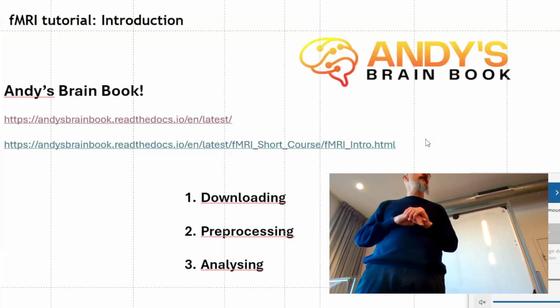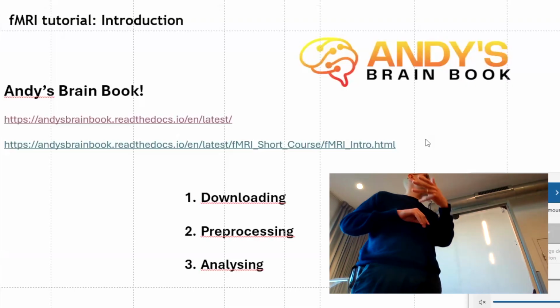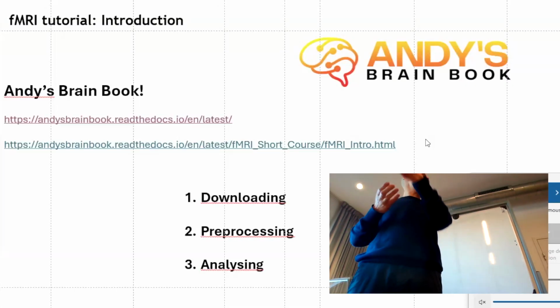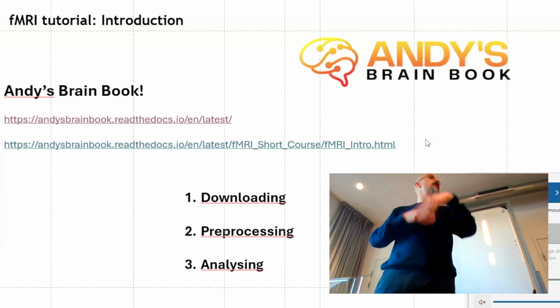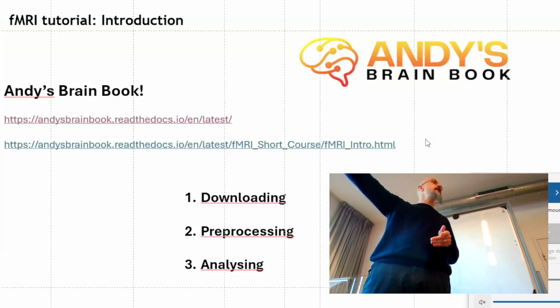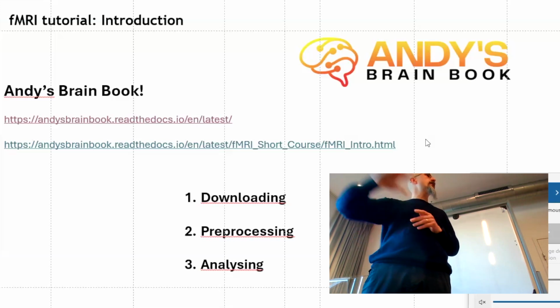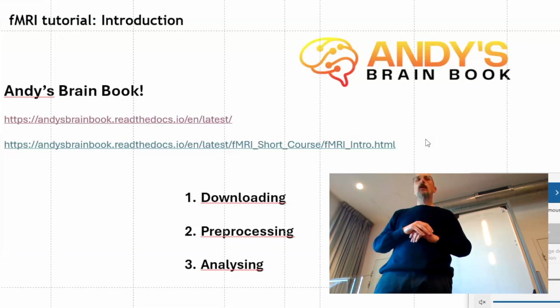It has a lot of details. I will not go into the theory of fMRI. I will be more on the practical side, so we will practice preprocessing and analyzing data. But at least you have the instructions and the resources where you can get information.